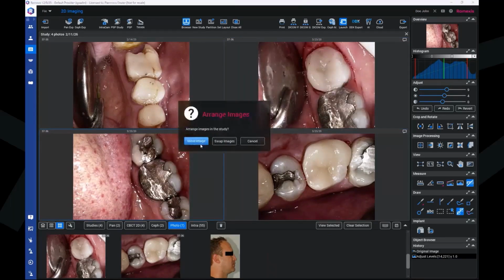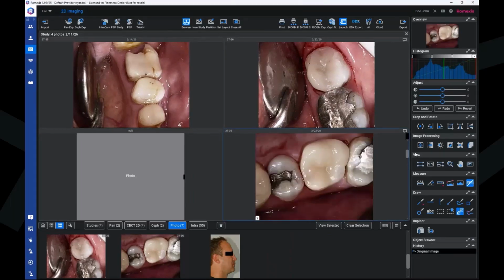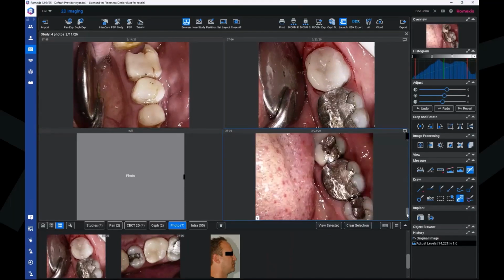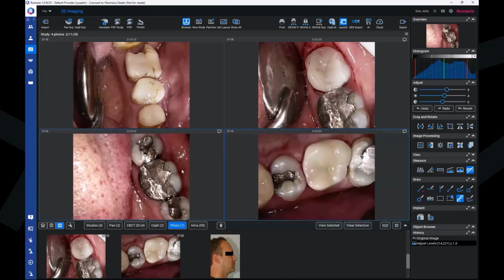And if I click move, then it actually makes, you will see, well, this one was left empty, and you will see that there's now this number 2 here. So it put the 2 images one on top of another. So this can also be a useful function sometimes. And then you can click and drag to the other place if wanted. Okay, but I think that's about the studies.